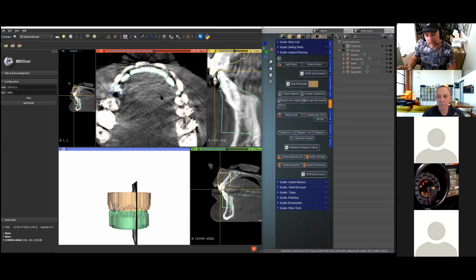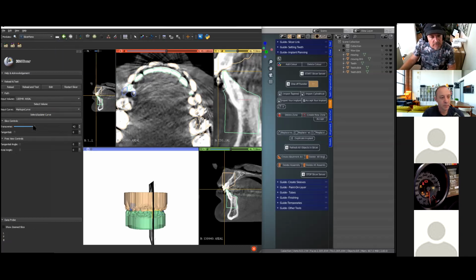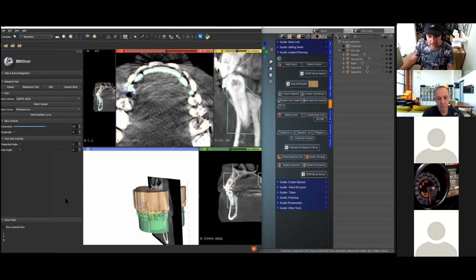now we are able to do the implant work on this. However, the lower model, we need to see the nerve as well. All right, so how do we do this? I'm going to go to the panel again, and we're going to move this slice over across to where the tooth is. So here.